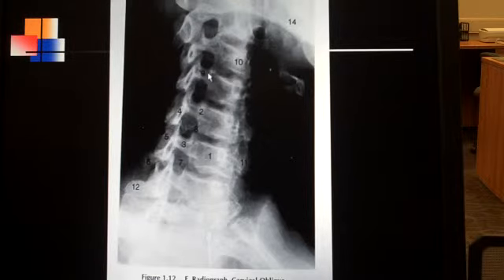Number 9 is labeling the pedicle. This is the pedicle that I'm going to describe in class as the bar, because you're seeing one sort of oblong, and you're seeing this one, which is this circle right here, and that's what number 10 is labeling on the segment above. That is the pedicle that you're looking at on end.